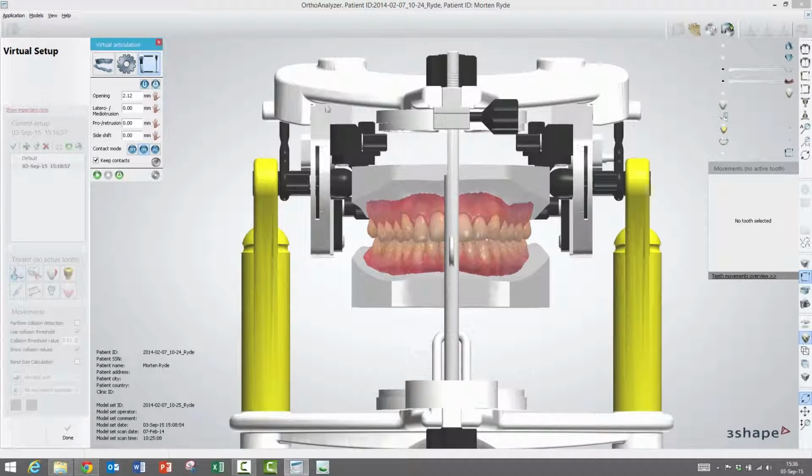Yeah, that's a good tip. Then a right click on the pin, and you see I have show incisor pin, so that can be deactivated or activated. And this time I have to click on the top of the articulator to get the same message and reactivate. Well, easy.